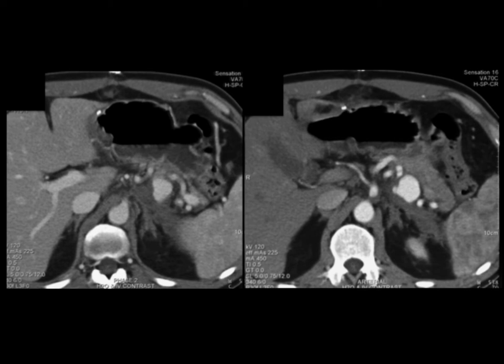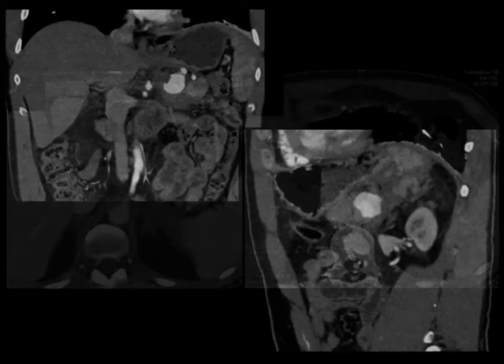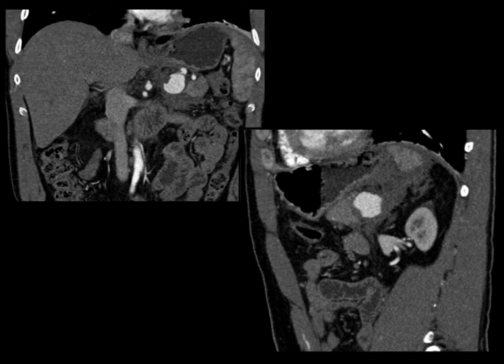This was eventually resected. This patient was very lucky because with the splenic artery pseudoaneurysm, and it was unclear why, patient was a weightlifter, you could see all sorts of problems. The patient can exsanguinate. So again, a critical diagnosis and one that needs to be managed very aggressively. And here's just a few views of that pseudoaneurysm with some of the clot inside of it.